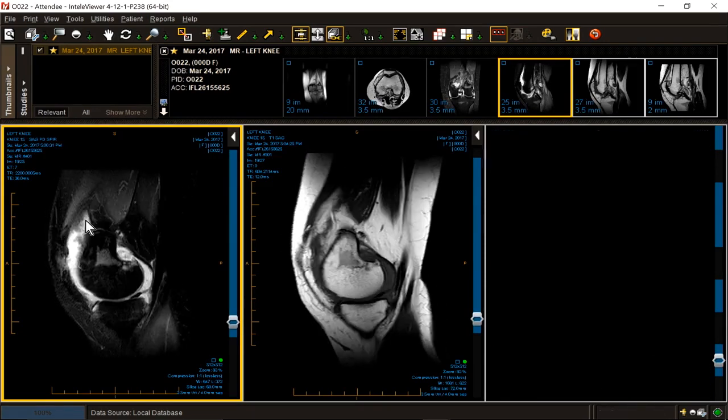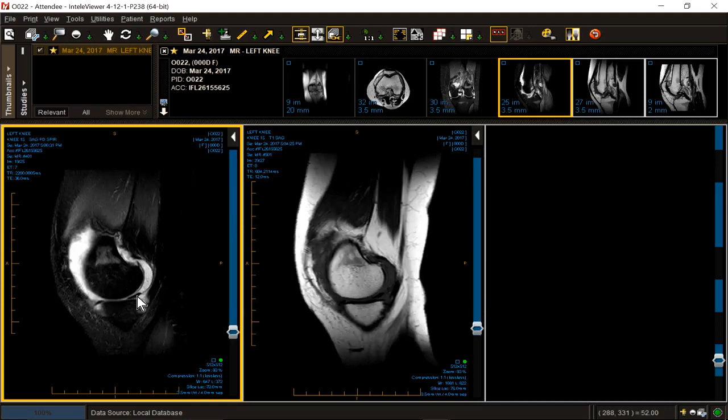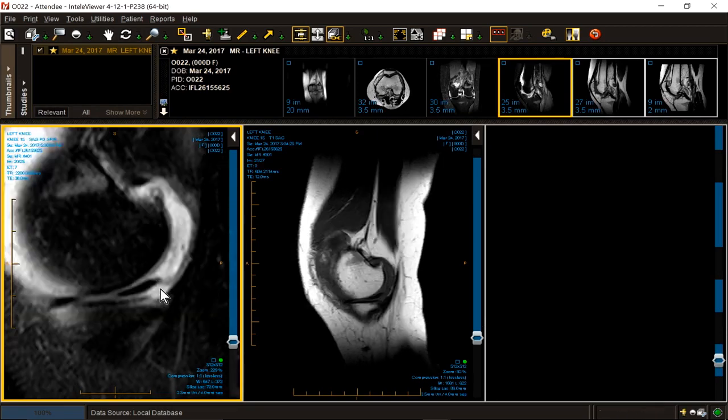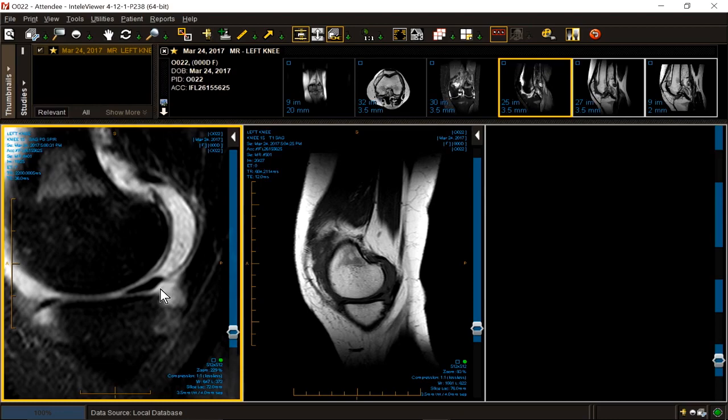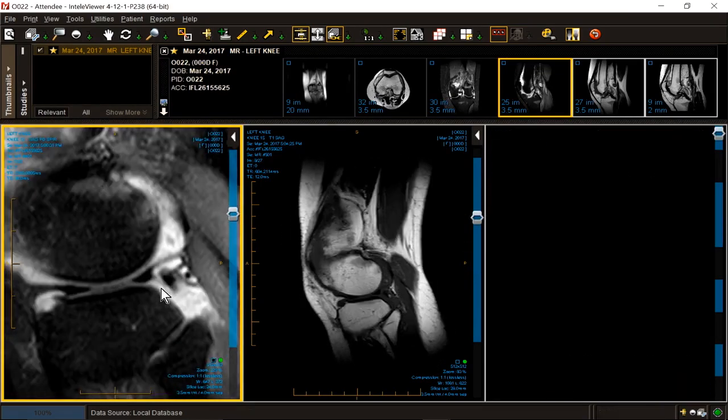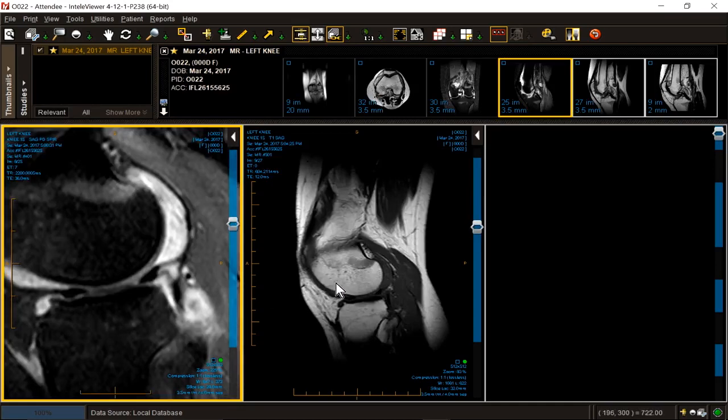We've got it. We want to see autodigestion, enzymatic digestion of cartilage, thin cartilage. Let's blow up our water-weighted image. Oh, it's thin. It's a 23-year-old lady, way too thin. We want to see small menisci. Autodigestion of menisci, she's got it. They're tiny. They're not torn. They're not displaced.